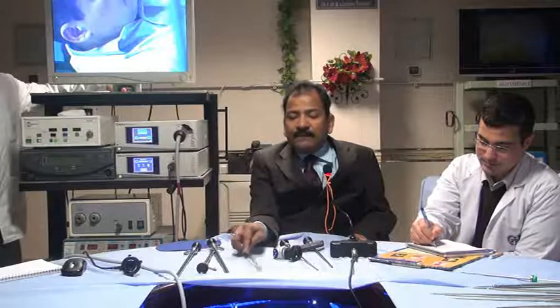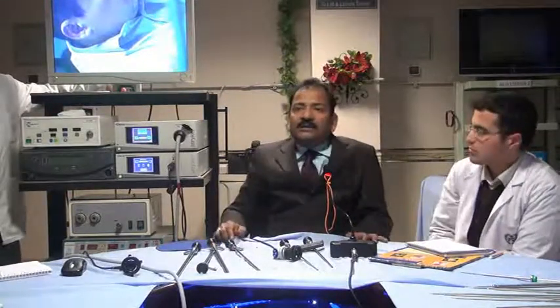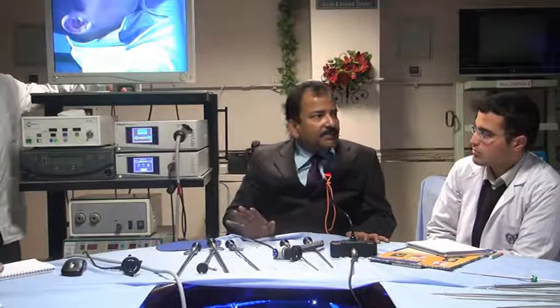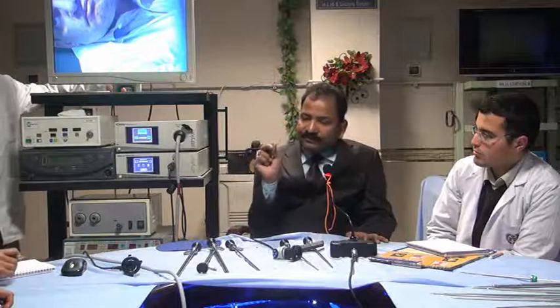You have all told correct, in a single chip there are 3 primary colors, red, blue and green, that is called RGB. And in a single chip, all the color is going through a single electronic circuit.